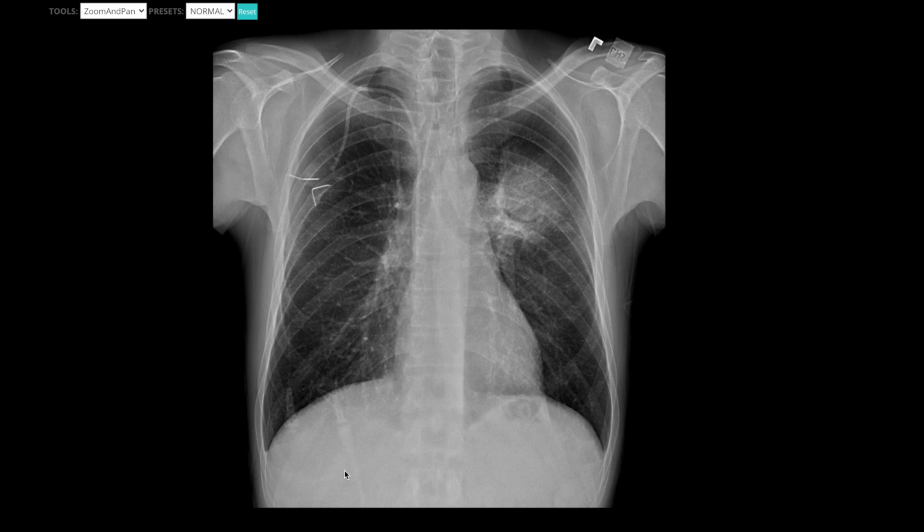The last thing that I'll look at is you never forget about the upper abdomen. Just like when you look at a KUB, you never want to forget about the lower chest. Whatever you get in an image, you should not just be looking for what you may be concerned about. You always have to look at the other things. So always look at the upper abdomen, make sure there's no pneumoperitoneum, make sure there's no large mass.